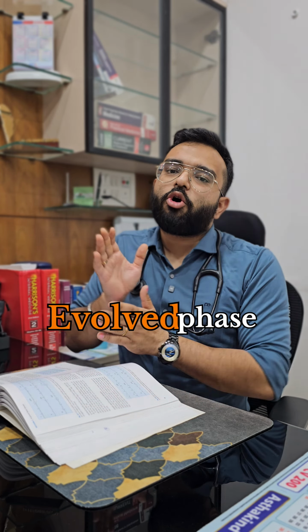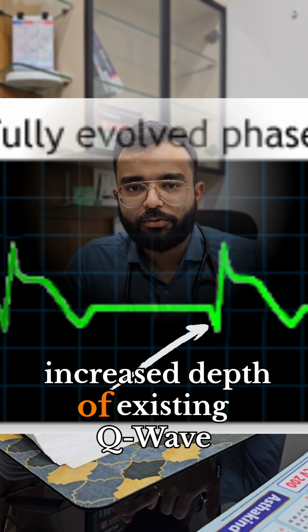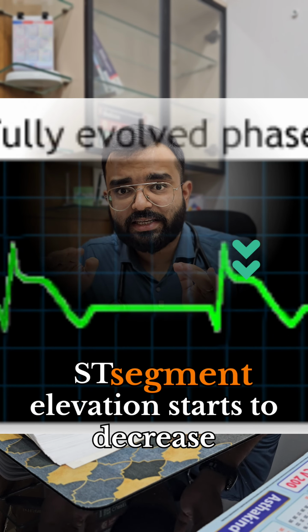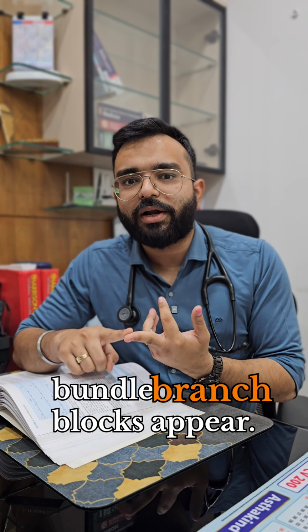Now coming to the evolved phase, necrosis has occurred, and this is represented by a new onset Q wave or increased depth of an existing Q wave, or decreased R wave amplitude, or the ST segment elevation starts to decrease, or T wave inversion occurs, and bundle branch blocks appear.